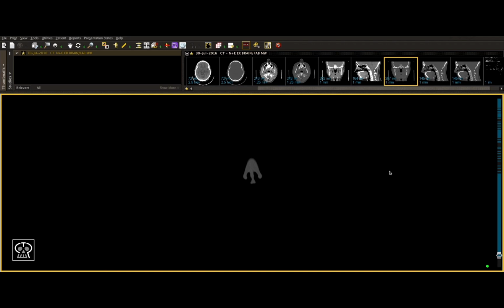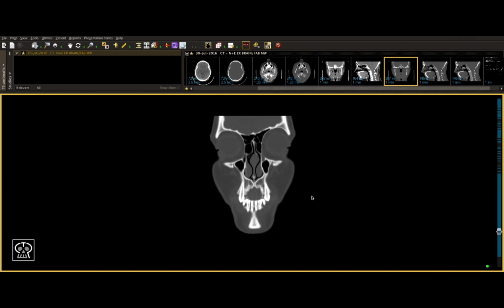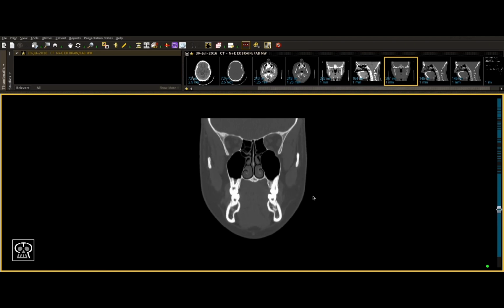Similar to the sagittal view, the coronal view for the maxilla is also a little bit difficult to analyze, but can provide some very useful information. Starting from the front of the patient's face and scrolling more posterior, we begin to see the central incisors and anterior maxilla come into view. As you can tell, once again, this view would be very good for dentoalveolar fractures, as you're able to see the teeth in the coronal plane as well as the entire alveolus.